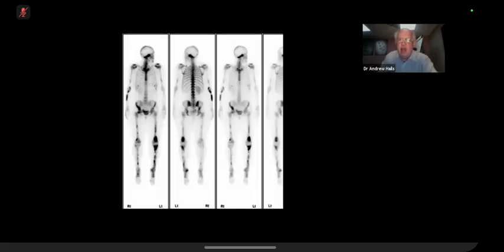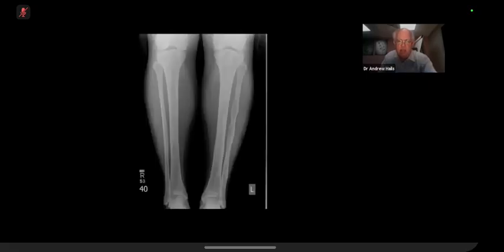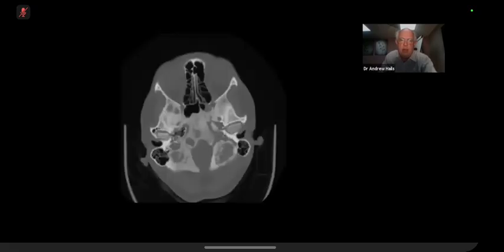And you can't really look at that image and say, well, that's fibrous dysplasia. But you could look at it and say, well, it's not Paget's. It doesn't really look like Mets extending along the bone like that. It could be Mets, but not so likely. It's not an arthritis. It's something in the bone, multiple bones, and this shows you that it's fibrous dysplasia, as we've got here as well. And in the skull base, we get increased density.